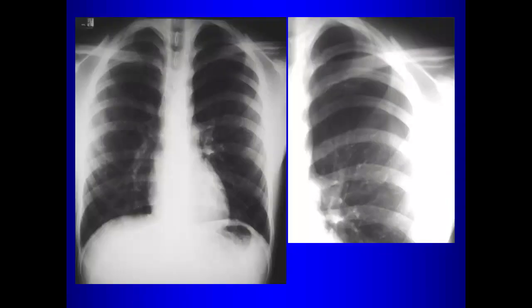So this patient has chest pain and shortness of breath. Does anybody see the abnormality? Well, first of all, what side is it going to be on?